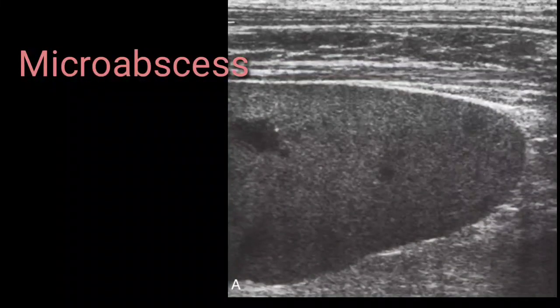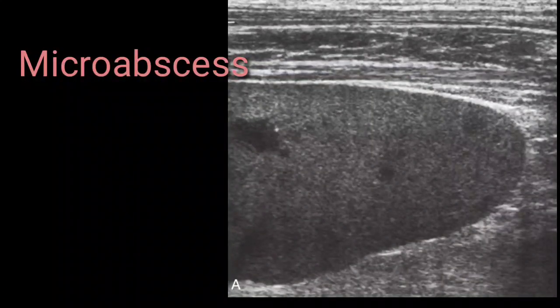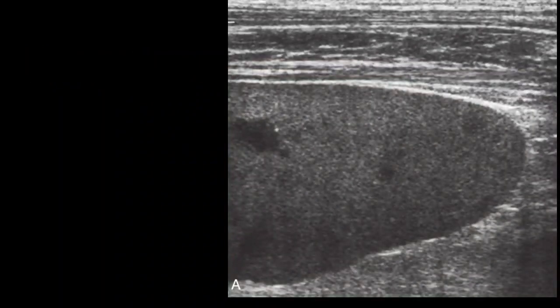It is always good to give the volume so that it becomes easy to evaluate whether it requires medicinal treatment or needs any surgical intervention. In the conclusion, mention multiple micro abscesses with the largest having a volume of 3 ml or 4 ml or whatever the volume is. Give that volume.